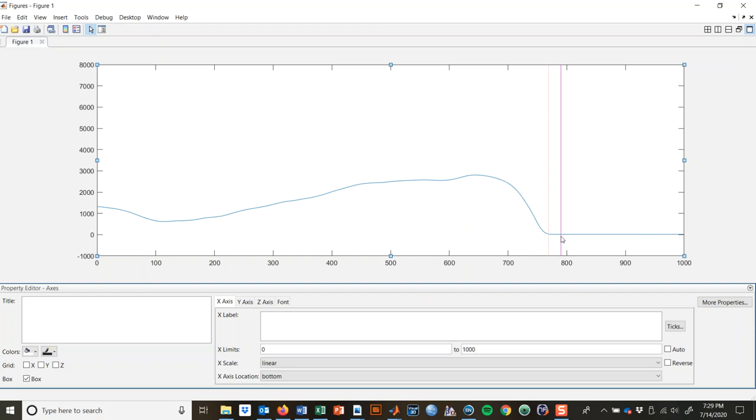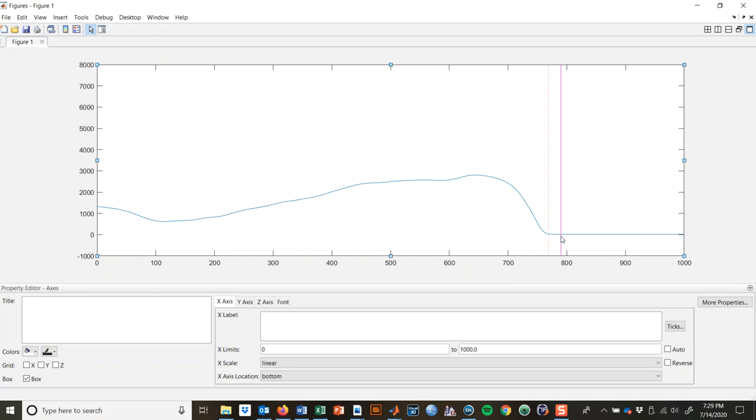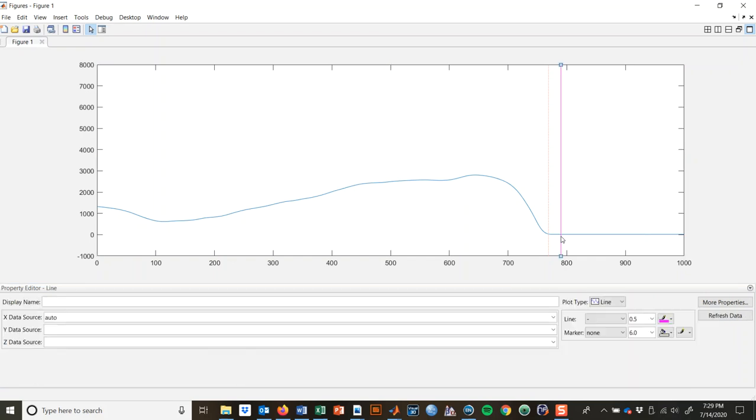It may, versus just a hard 20 Newton threshold or 30 Newton threshold, it may detect it too late. Something to think about there is, are you filtering the data? In this one, I chose to filter the data. So we're going to get a little bit of effect here on the curve that is going to make that difference. If you're not filtering the data, it is very unlikely, in my opinion, that that is going to happen here. Okay? So if you are filtering the data, perhaps a hard 20 Newton threshold would be ideal.